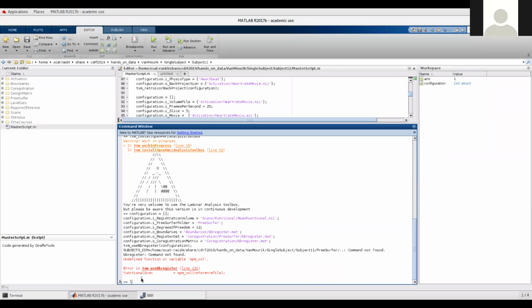So if I ls to /opt/local/spm, oh, sorry, spm, and there is spm 12. And if we add that to the path, and I'm going, oh, would you like to write it down? I will start it reading. Yep. So add path, no, add path without, yep, there we go, without any.